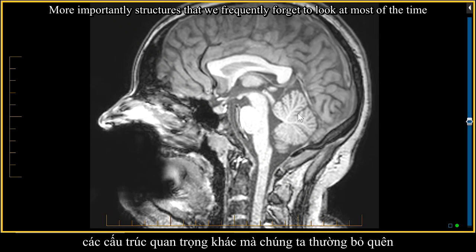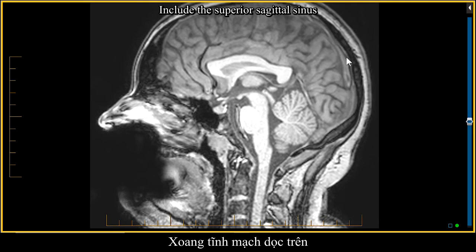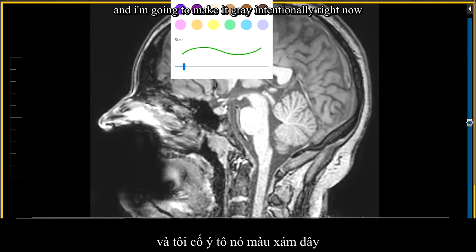More importantly, structures that we frequently forget to look at, most of the time we don't forget to look at the pituitary gland, include the superior sagittal sinus, which will frequently have in-plane, slightly hyperintense, wispy flow. But it shouldn't look like a big, fat, intermediate signal intensity gray worm. And I'm going to make it gray intentionally right now.